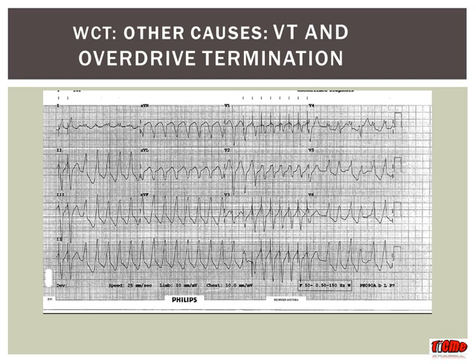Here's another funny looking VT, where what we've got here is a native VT with someone with an AICD in, and then what it's done is run through a burst pacing, overdrive pacing cycle where it's given 8 faster shocks, so it's overdrive paced the patient out of their VT and into this sort of ugly looking wide AF.